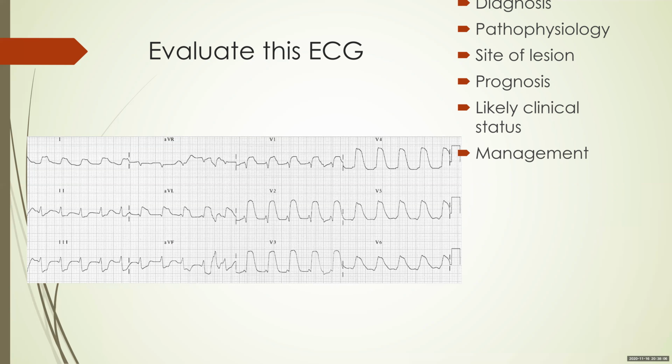This is especially supported if you have left atrial enlargement on an ECG. Again, we're not seeing that clearly in this ECG. Left atrial enlargement will signify that the LA pressures are higher and the patient is likely to go in for pulmonary edema. So you expect this patient to go in for heart failure because of the site of occlusion, the degree of ischemia, and the tachycardia you see on the ECG. The management is pretty obvious. It is primary PCI, which is preferred over thrombolysis. Again, you expect incomplete recovery of this patient and a worse outcome.